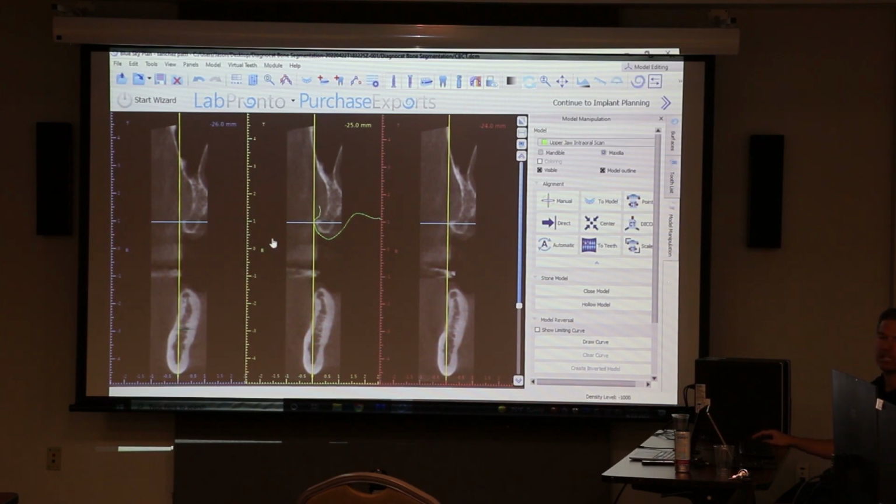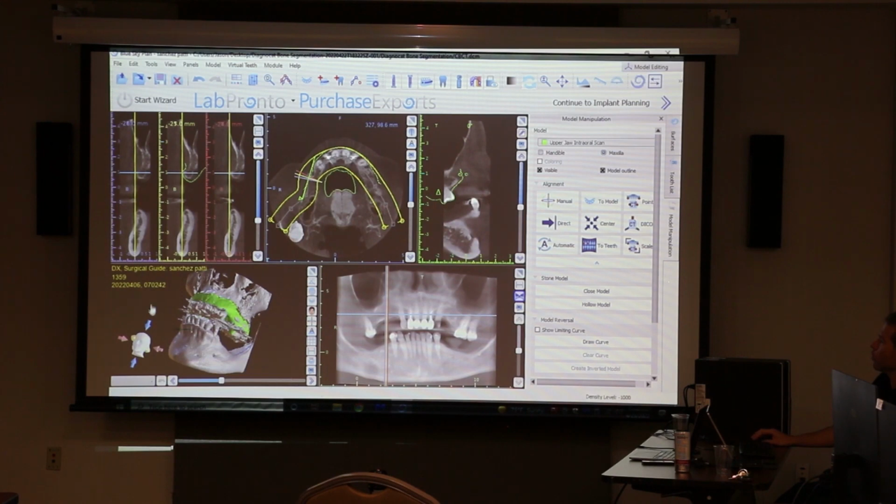So if you're doing an edentulous case, throw some cotton rolls under the tongue and the vestibule, get the cheeks and the tongue away from the ridge, and create air spaces, and that'll show up a little bit better. All right, so we're going to move forward on this. Let's say we got it stitched. I still hate how much scatter is on this.